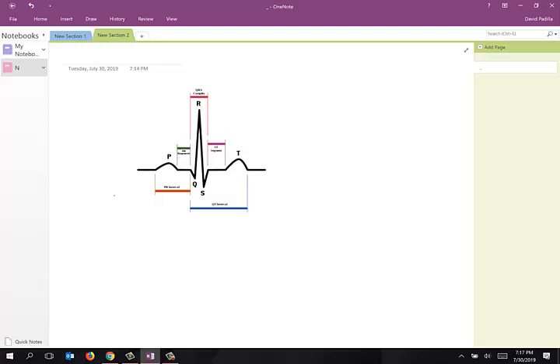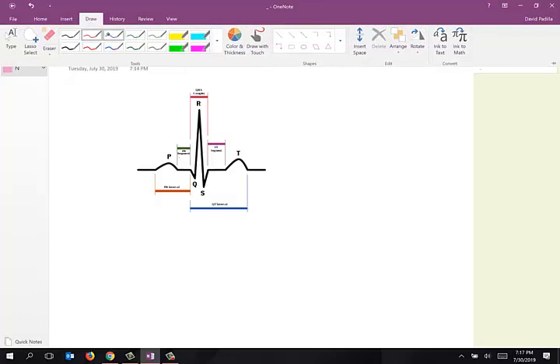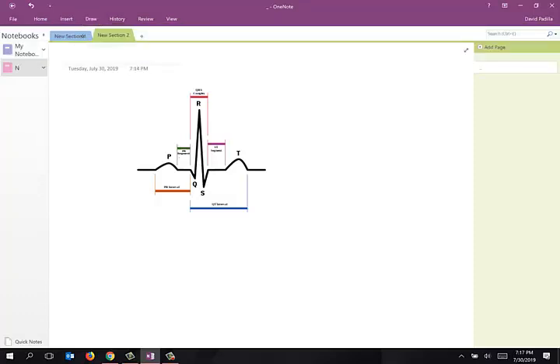So the first concept here is the concept of the QRS complex. When we look at a QRS complex, these have many different forms and it can be a tad bit confusing. The image on the screen right now is a true QRS complex, but not every EKG looks like that, right?